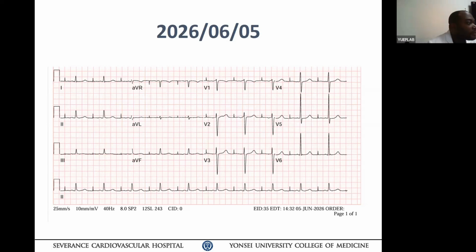Is it really clear? Yes. How do you know? You can look at the EGM. So you should know the interatrial conduction delay during the EP study. That's why we need to put a catheter in the right place. That's why in atrial fibrillation ablation, no matter what, where did you hook up the atrial lead? The right atrial appendage, just the conventional point.